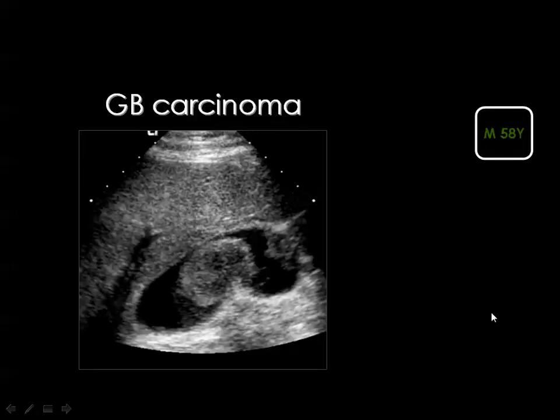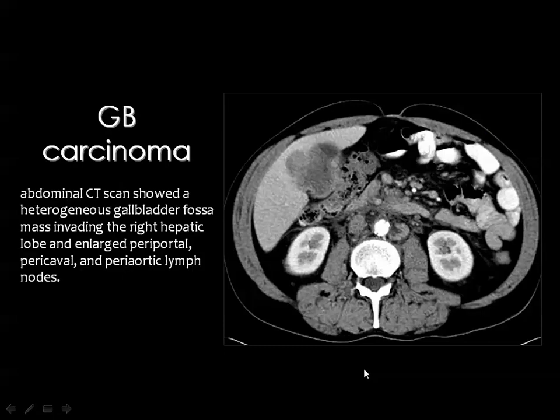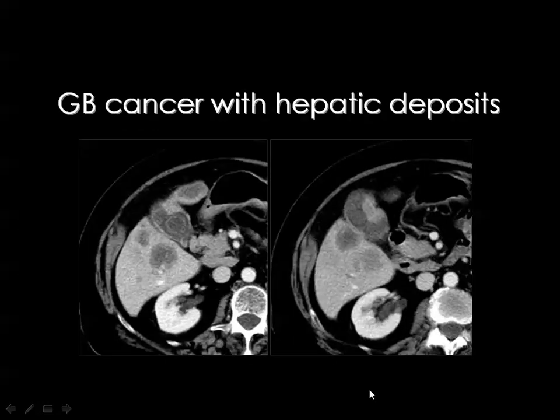parenchyma. And if you see a mass inside the gallbladder, like this one by ultrasound, and the mass is above 1 centimeter in diameter, the gallbladder wall adjacent to the mass is thickened, then you may predict the nature of the lesion as carcinoma, and this should be confirmed by surgery. And this is a mass infiltrating the gallbladder fossa as well as the adjacent liver parenchyma. Then you can diagnose gallbladder carcinoma, and if you look carefully in the para-aortic area, you can see some lymph nodes.